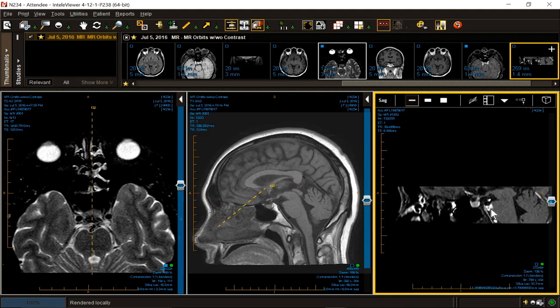I hadn't noticed it before, nor had my original colleague, and that's why we have 100 radiologists in the room reading these. Fantastic. I think you're right. I think it is abnormal. We'll go back and amend it. Beautiful. All right. Let's talk about thyroid ophthalmopathy.